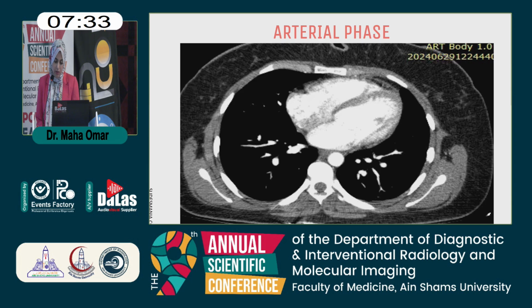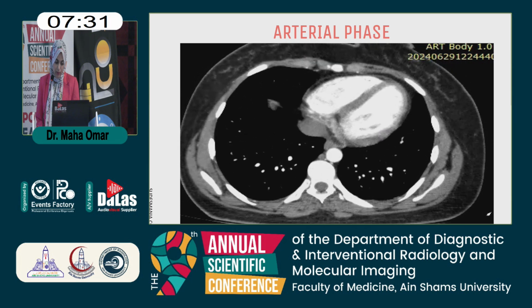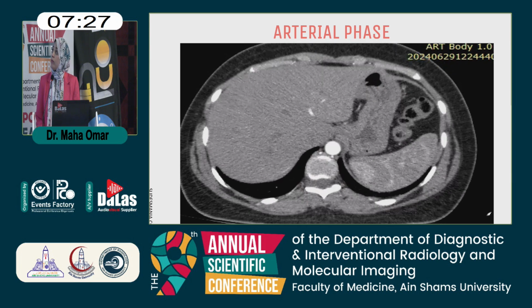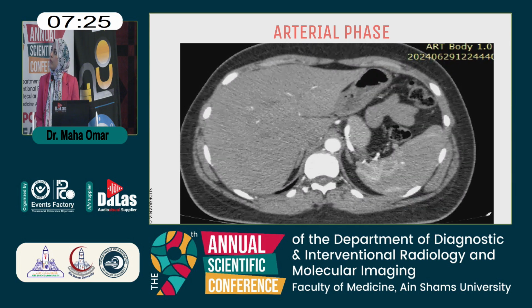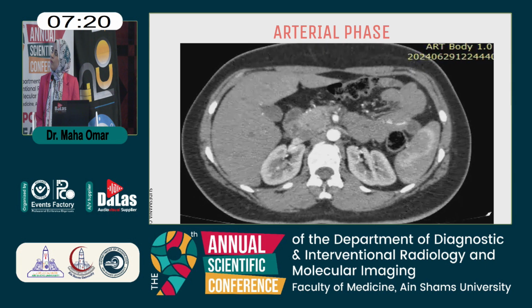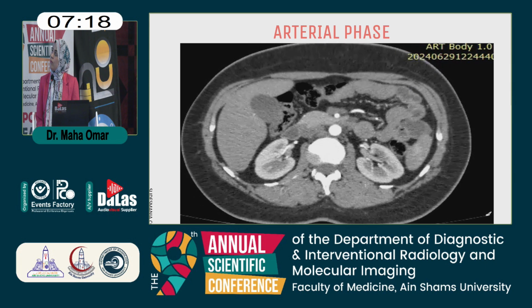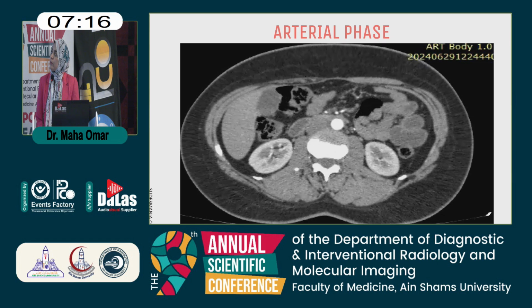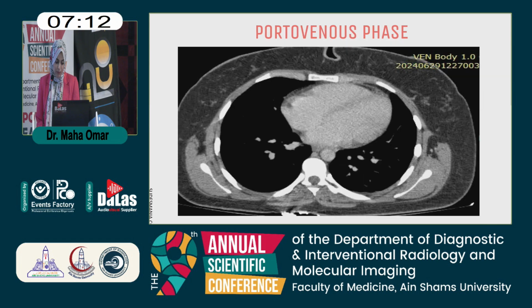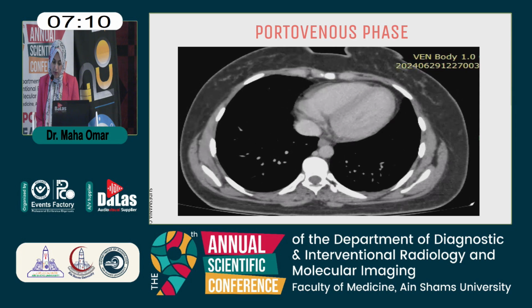Okay, this is the arterial phase. The portovenous phase.